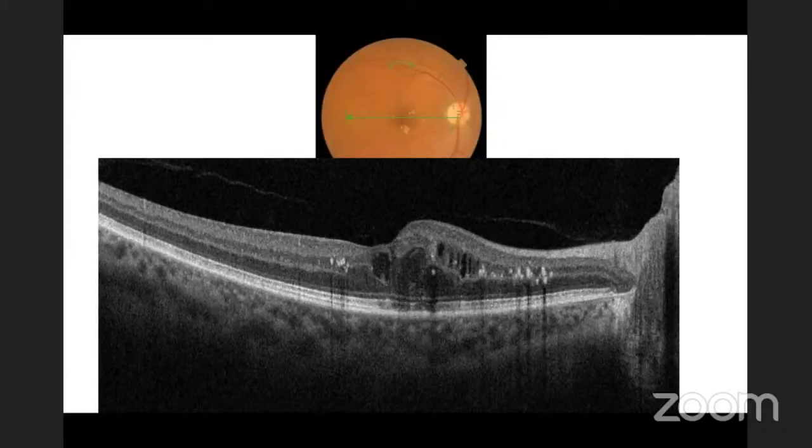In addition, you have cystoid spaces which are also involving the outer layers, and you have a very much intact outer retinal layer, including the RPE, the photoreceptors are all intact. And the inner retinal layers, you are able to identify all of them individually. And so I can confidently say that this patient does not have DRIL, or what is called disorganized inner retinal layers. Similarly, this patient has an intact outer retinal layer and the ellipsoid zone, the photoreceptors.